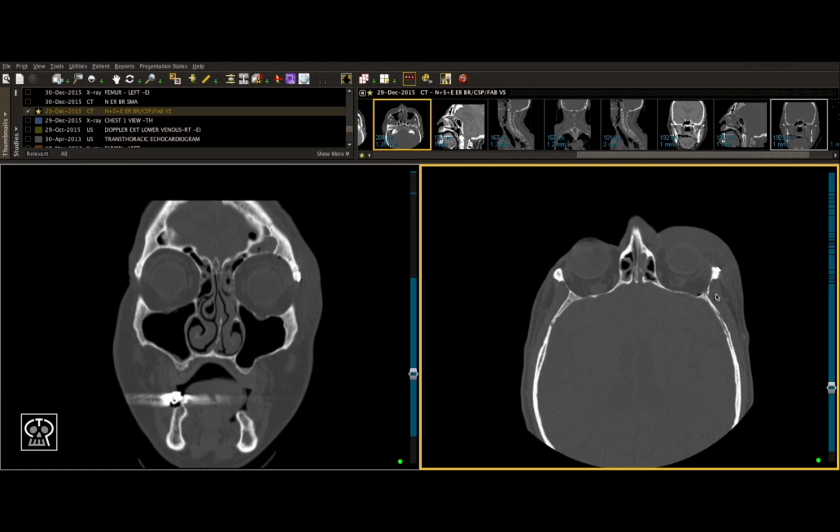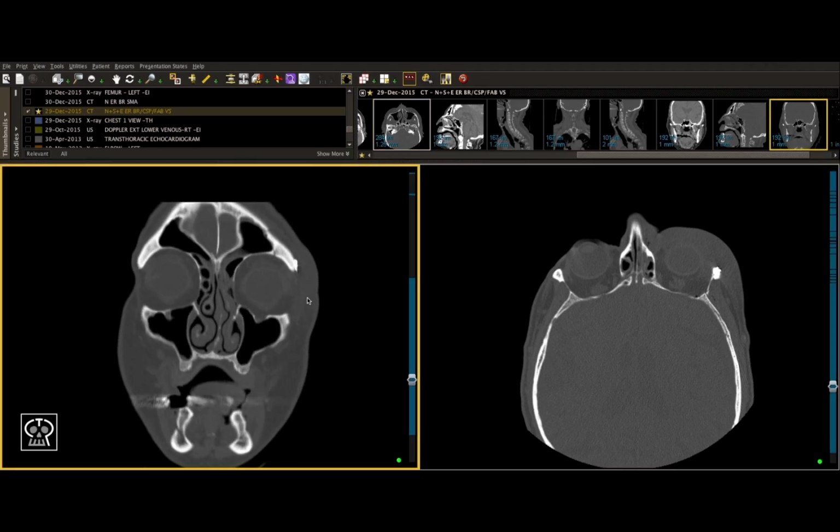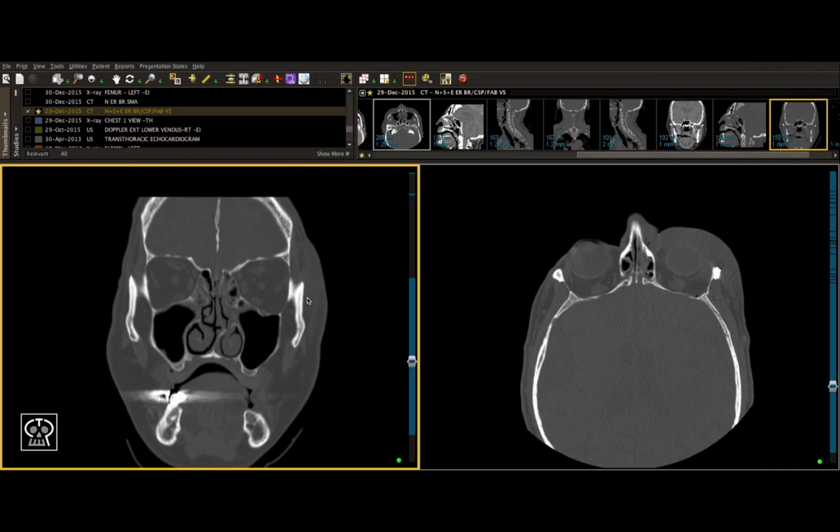You can see this very, very small fracture in the lateral wall that wasn't able to be appreciated on our coronal or sagittal views. This further emphasizes the point that whenever looking at a facial trauma scan, you want to look at all three views, go systematically through every view, and look at both sides from front to back all the way through the scan. You'll pick up new fractures in different views, especially small and subtle ones, and that'll separate you from the other residents. So at this point, we'd be able to diagnose on this scan a patient with a left orbital roof fracture and a left lateral wall fracture, as well as plates and screws indicating previous surgery.